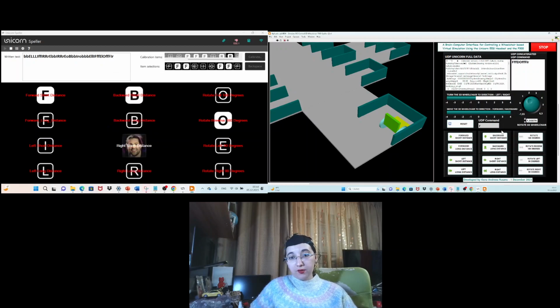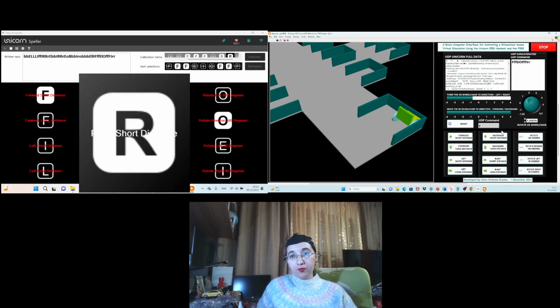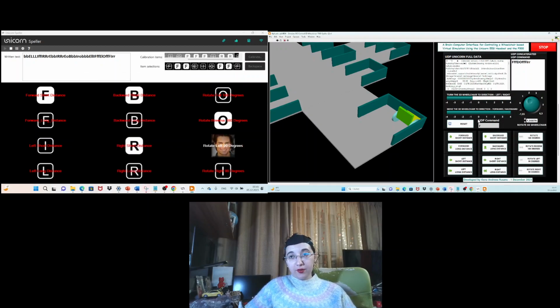Let's continue with the next command. Again, right short distance. Yeah, it's okay. Let's see the next command. Rotate left with 90 degrees.